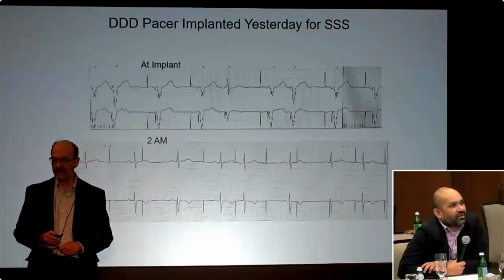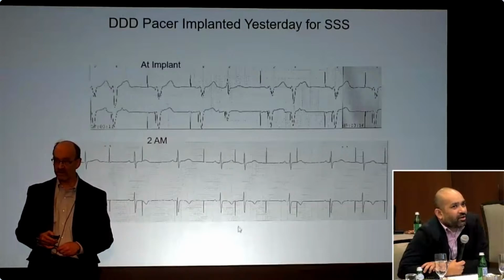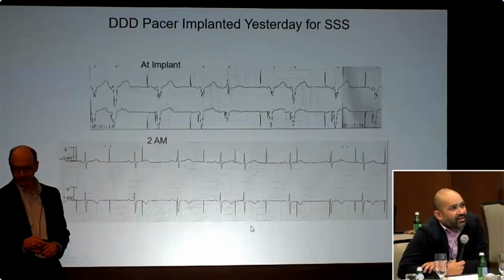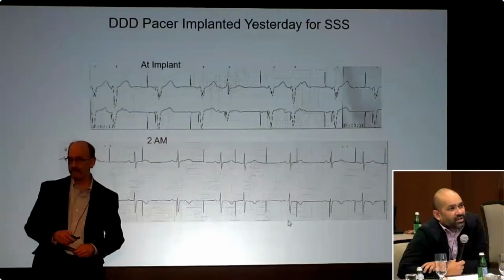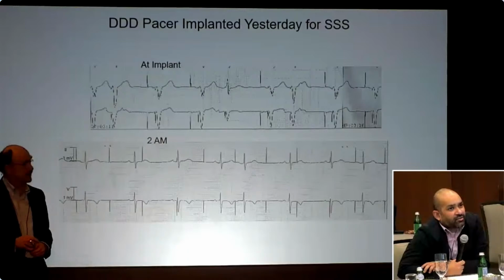And how come it comes early? That portion looks like once you have a pacer spike, you're capturing a portion of the P wave, and then you have a QRS that follows it and conducts. Then the next one after that, I see the pacing spike again, but I don't see that you actually capture the atrium, and similarly no conduction down to the V. Then you come back with sinus rhythm until the second to last spike, where again it seems you are capturing the atrium and then conducting down to the ventricle.